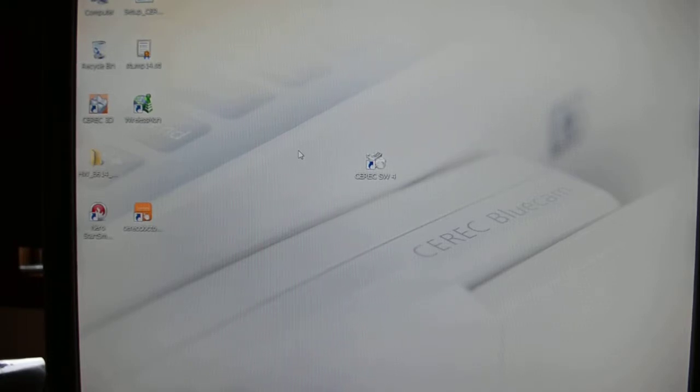All right, so welcome to Module 1 for CEREC. We are going to walk through this just as if I would walk through the computer for the very first time, so it'll be a little bit of a refresher if you have taken the introductory seminar, and it'll be a great reference tool for you in the future.